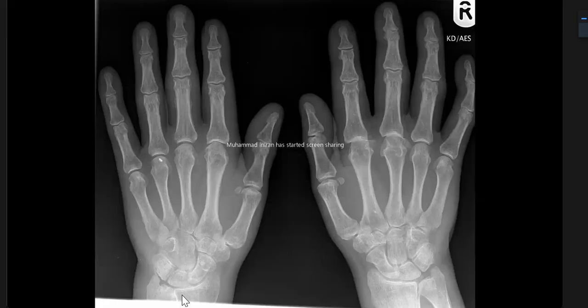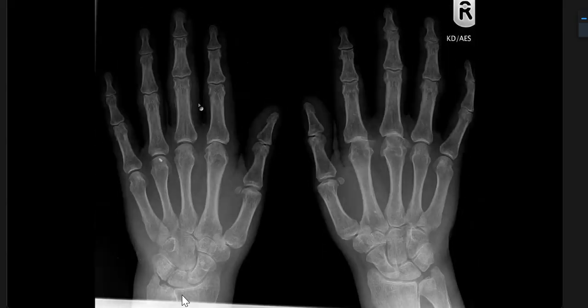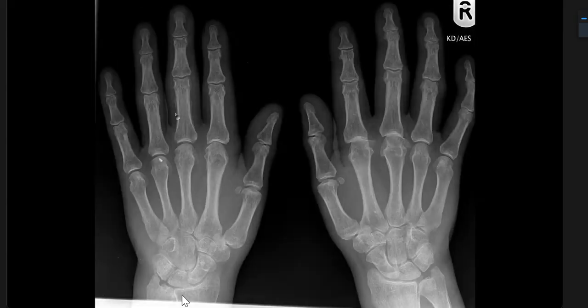Again, the approach was good, but you are spending too much time. Your knowledge is there, the explanation is good. Try to be slick and try to be focused. In the exam, you don't have to describe each and everything. It's not a report you're typing. You have to be very focused. Talk where the money is. Go where the money is. Here, the money is in this periosteal reaction.